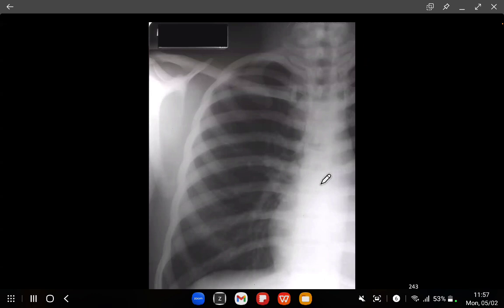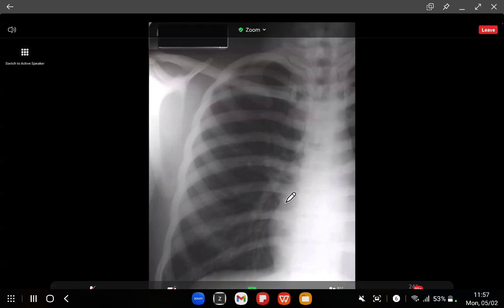Chest pain. And this is a close-up showing sclerotic bones. What do you think of that vertebra there? H-shaped vertebra. All the other vertebrae are normal shape. Can you get one abnormal vertebra in sickle cell? Yes, you can. And this is the H-shaped vertebra.